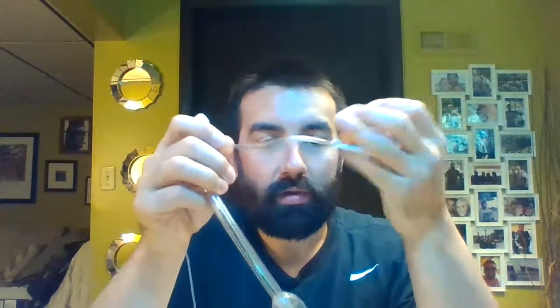That being said, sometimes things go wrong with these, and you're having to try and figure out what's going on. You hear weird noises coming from your patient's airway. Sometimes this can almost latch onto tissue since there's just one port on here. So if you're trying to figure out, is that noise a cuff leak? Why do I hear this upper airway noise? Sometimes I will disconnect this as I'm troubleshooting that patient's airway. Okay, so subglottic suction. Talked about a lot of different parts here.